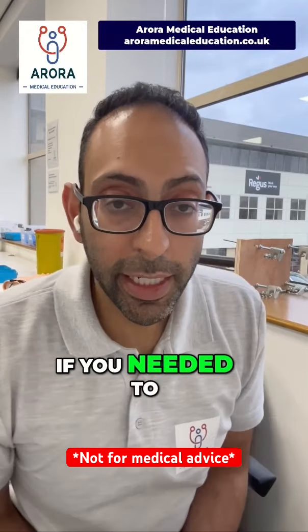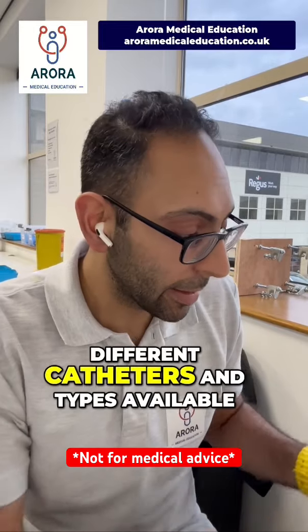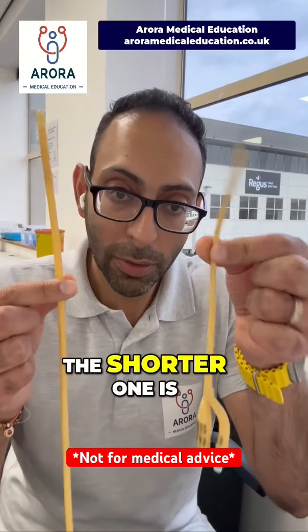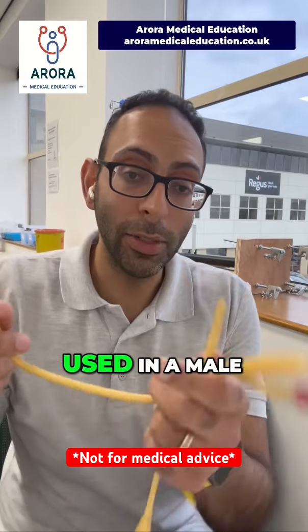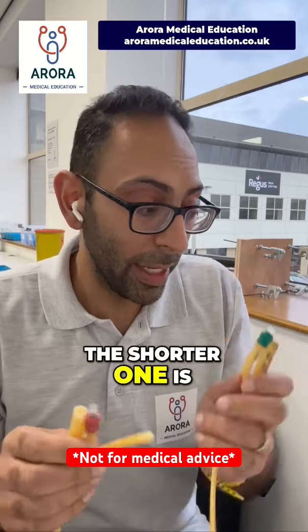Hi guys, everyone. If you needed to do a catheter case in your exam, let's quickly go through a few basics about what you might find in terms of the different catheters and types available. So remember, you've got two main different catheter types. Okay, this is a catheter. The shorter one is obviously used in a female. The longer one is used in a male. So if you get two different lengths, two different sizes, make sure you think the longer one is the male, the shorter one is the female.